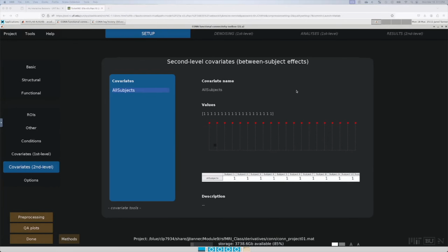The first step of pre-processing finished up. It didn't take that long to do. And so I'm going to now show moving on from there. What I did do is I closed the window that was showing the processing, and this again didn't take very long, maybe 30 minutes tops to do that first step.